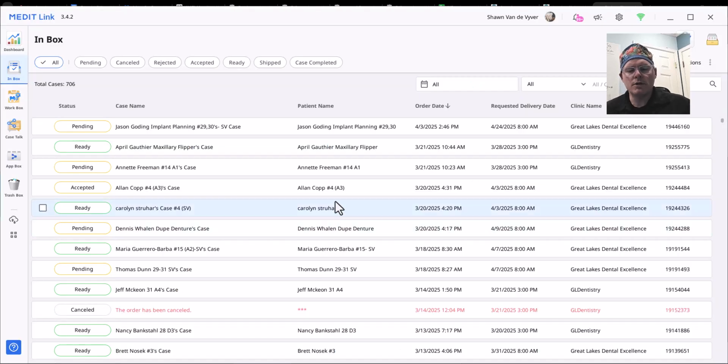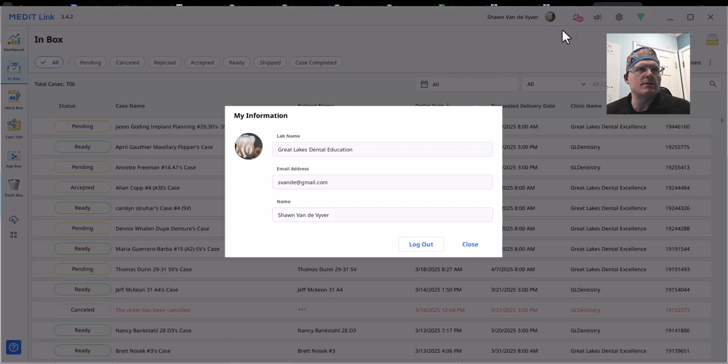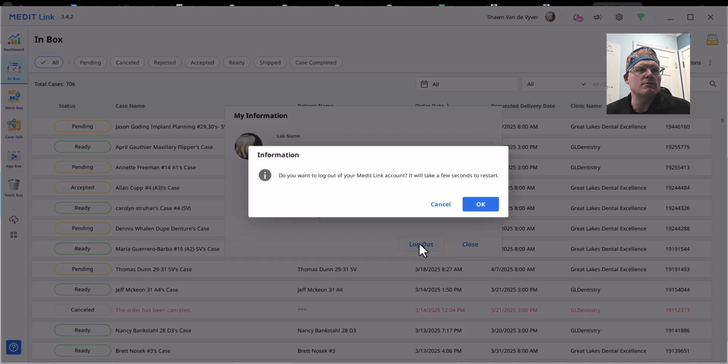All right, so we're going to go over how to do just a regular single crown. We're going to start off by getting our scan from Medit. Right now I'm logged in as Exocademy, but I click the profile button here and do log out.